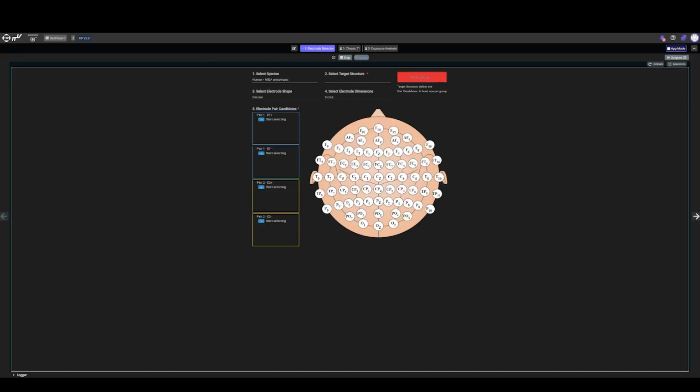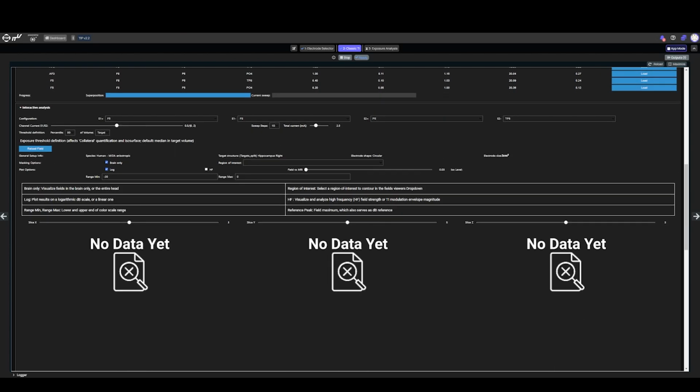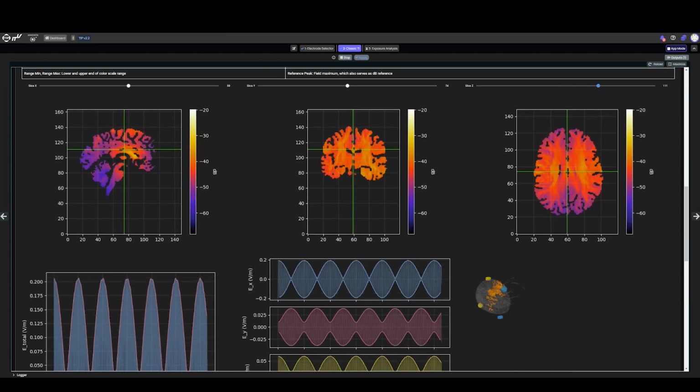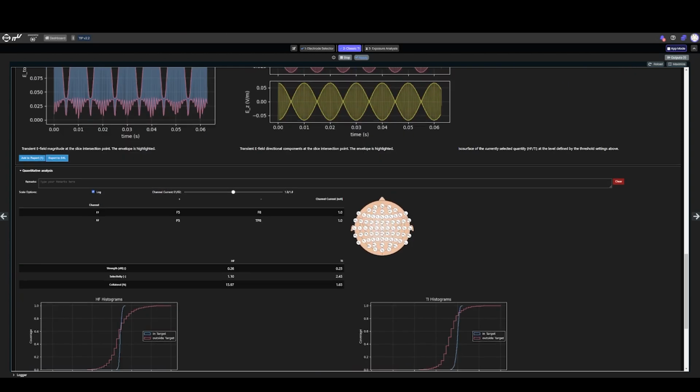In the non-personalized version, TIP contains 3 steps. In step 1, the user defines the problem space, for example, the target brain region. In step 2, an optimized stimulation protocol is identified automatically or interactively, and the resulting stimulation conditions are visualized and quantified in terms of key metrics.